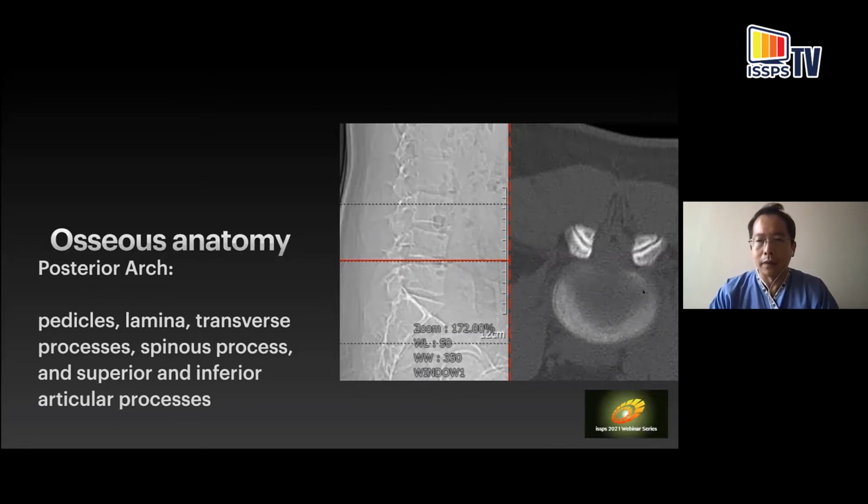So at the disc level, this is a very characteristic appearance. We are right over the intervertebral disc here. It's dark, there's loss of bone. You can see some margins of the bone on the side, but the nucleus pulposus is dark because it is not calcified. Coming back again, you can see the ligamentum flavum, the thick limbs of the ligamentum flavum, the small epidural space in the back here, and then the spinal canal containing the spine, the thecal sac, and the CSF.